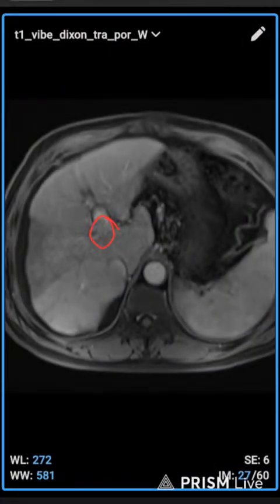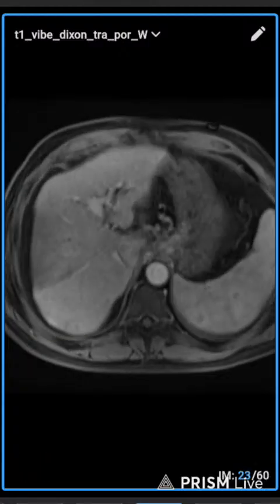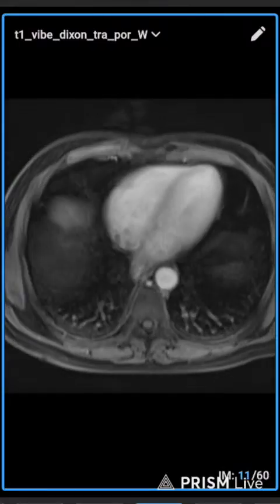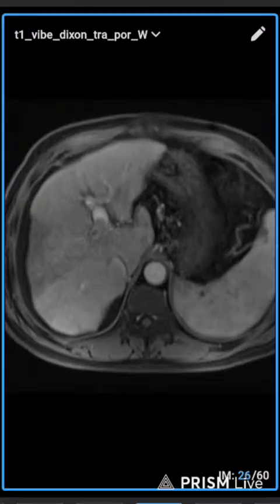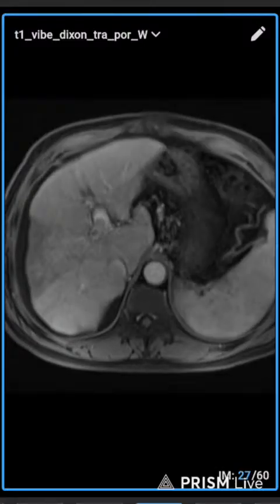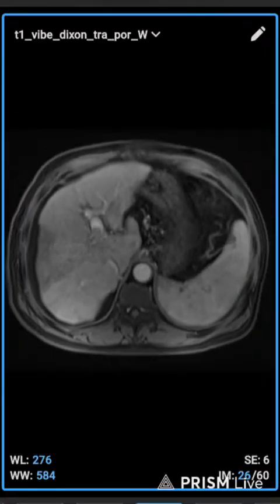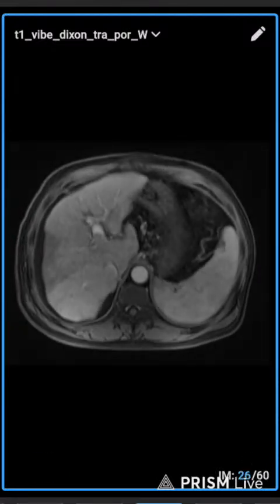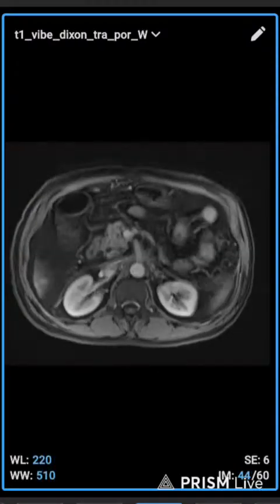It's called, I forgot it. Here you can see the hepatic vein was dilated for this blockage. It's called, I will find out when I remember the point. I will tell. Right now it's not in my mind.